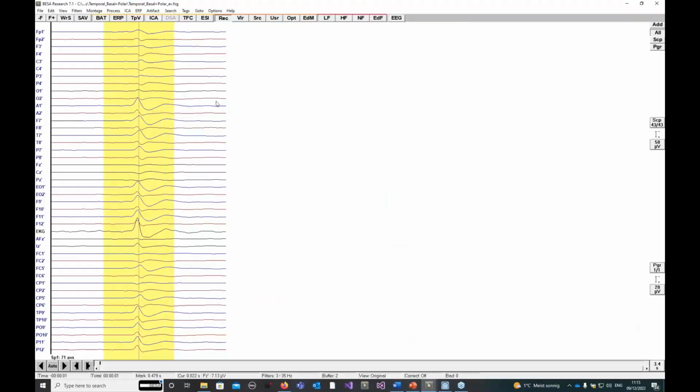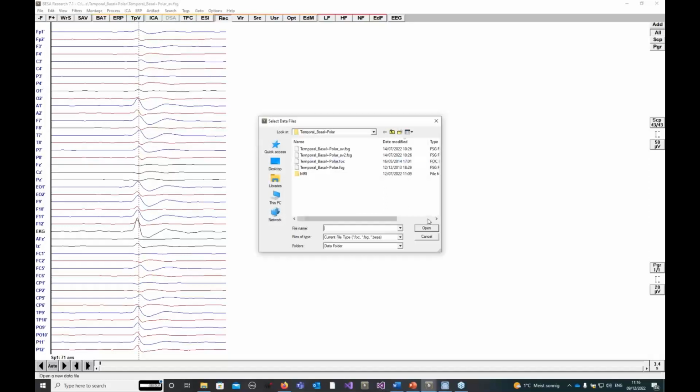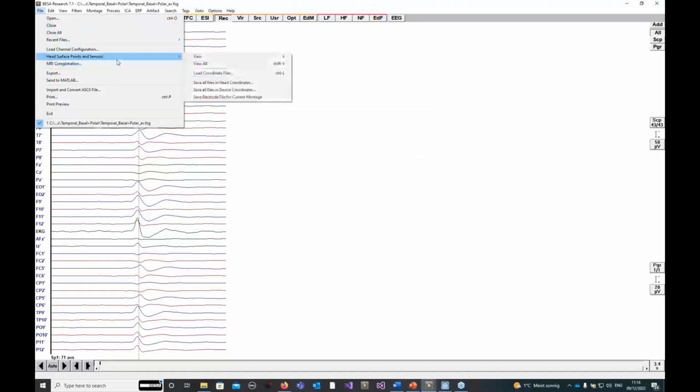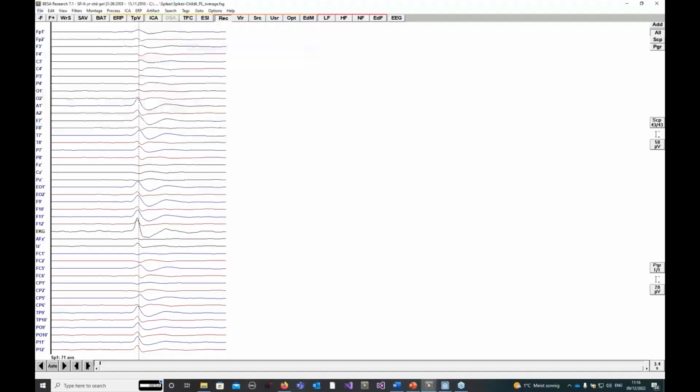Good. And then I just wanted to give you one more idea of what we can achieve if we don't have digitized information available. So let me just open one more example data set. That is in my recent list. Recent files, child 6.